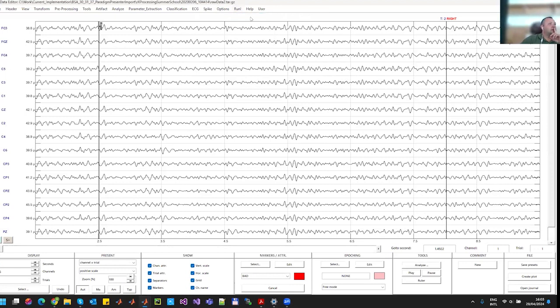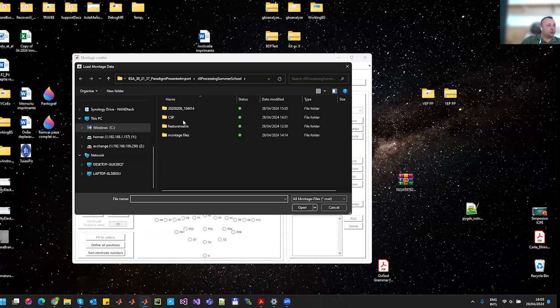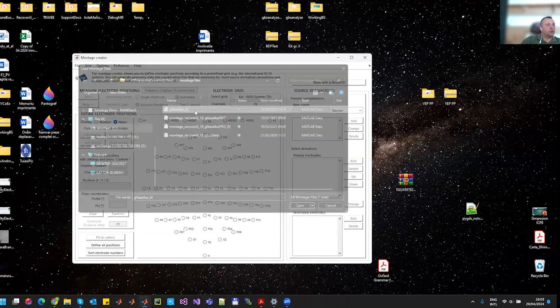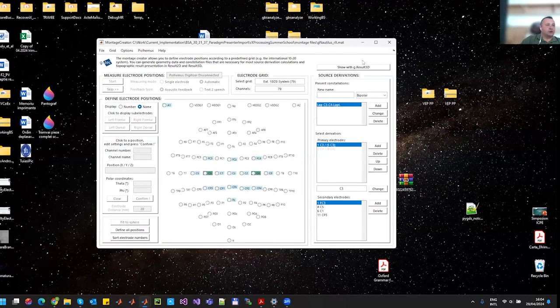So montage creator. Right now I will load the montage that we used for recording this dataset for recoveriX. So now the montage is loaded.